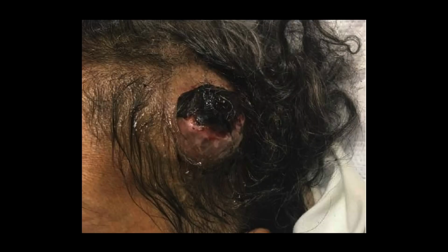However, in a patient that presents with something like this, we may have more questions. These two patient presentations span the potential of soft tissue infections, something very simple versus something that makes you pause and say, wait a minute, what is that?